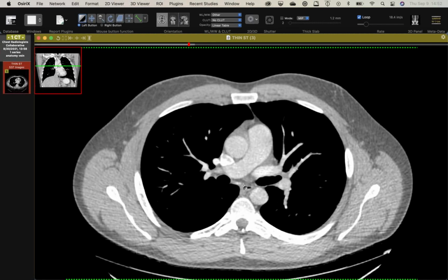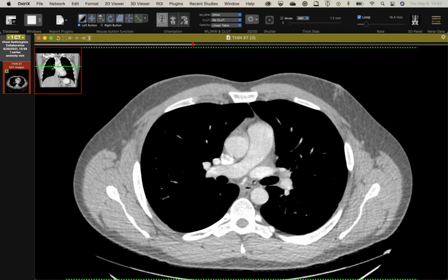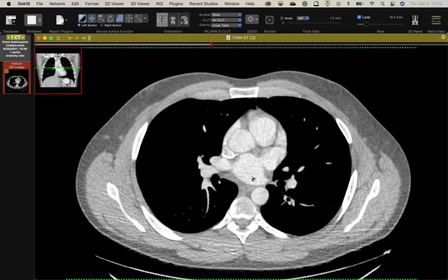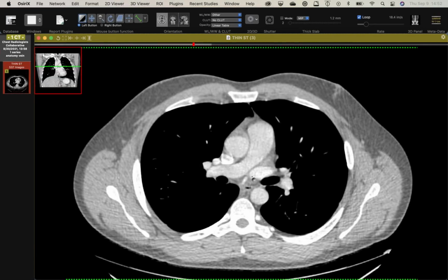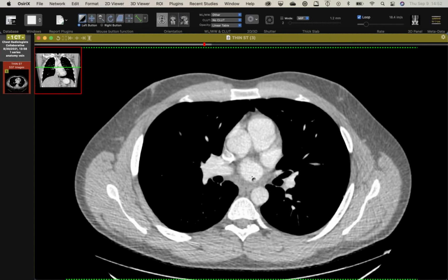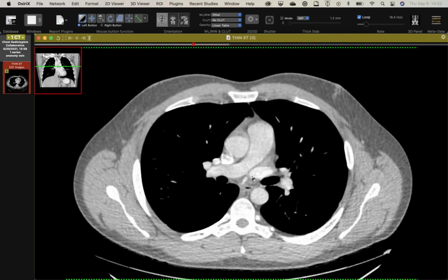This little guy here actually goes into the mediastinum and crosses over and enters the left superior pulmonary vein. So is it an aberrant top pulmonary vein? It's a meandering top pulmonary vein. Yeah, it's just cute. Mediastinal meander. Mediastinal meander, two M's. Yeah.